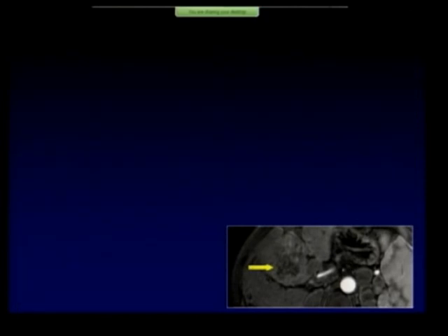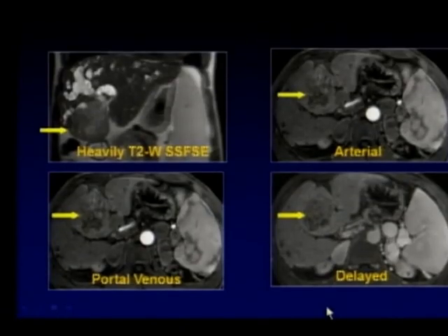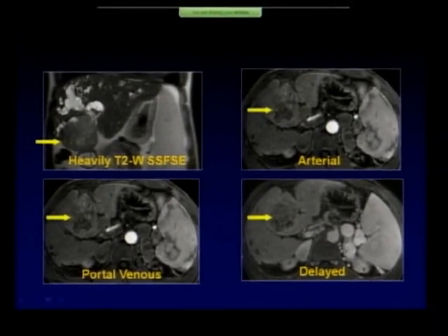Let's talk about our next friend. You can see an infiltrative sort of lesion. If you take a pencil, you can definitely not draw it out. You cannot figure out the boundary of this lesion. Additionally, this patient had Caroli's disease. You can see multiple dilated bile ducts in the liver. This is a large lesion hanging down from segment 5 of the liver.